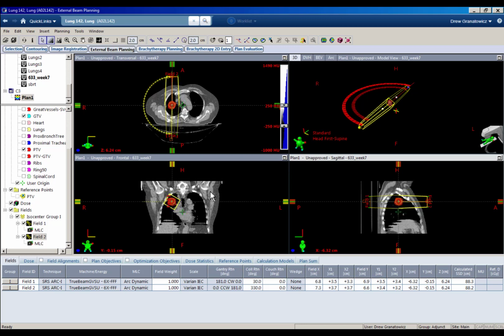Your objectives probably will look the same, but if you look at low isodose lines, like your 20% line or your 10% line, you can almost cut the volume of that dose cloud in half sometimes with your couch kicks. So your plan's going to be better. If you're shooting for a lower R50, couch kicks are going to help you out.